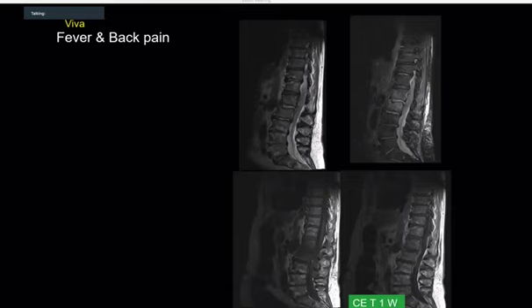It's, I'd say, meningitis of the. No, please remember that basically it is spondylodiscitis, right? So there, spondylodiscitis, same like the previous case, and this is an inflammatory phlegmon. You are right that the dura must be involved, but don't use the word meningitis here, it is a phlegmon, which goes with this.